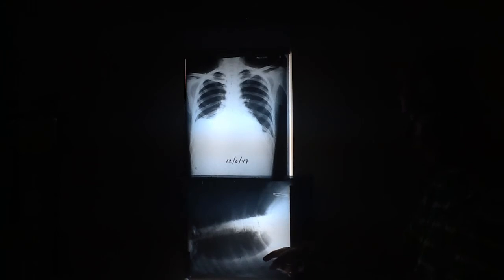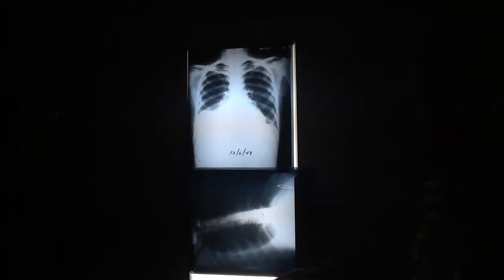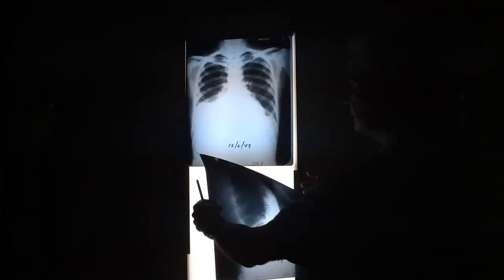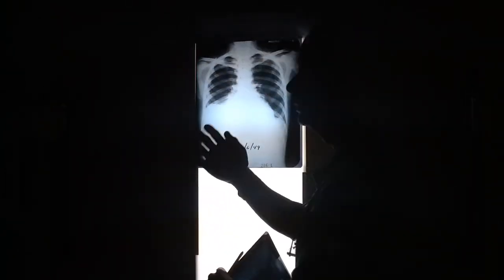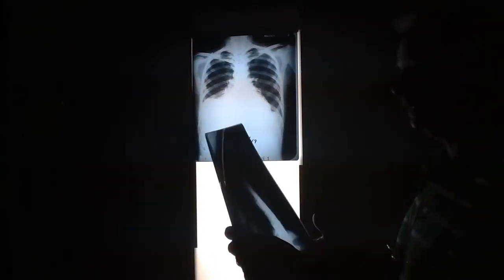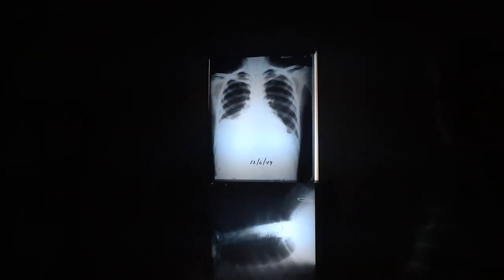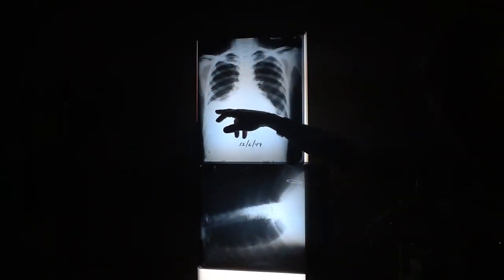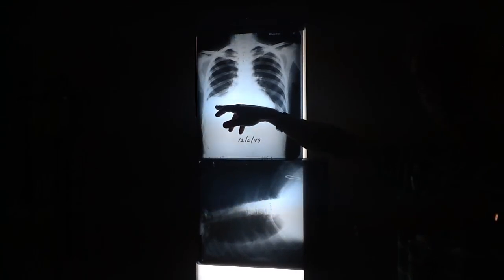And when you lay them down, look what it did. Then it layers out along the chest wall. And if we stand them up again, it goes back down like this, over the diaphragm, and lifts the lung base up off the diaphragm. Why it does that, I have no idea. But it only does it in a very small percentage of people. It's an atypical pleural effusion. It's called subpulmonic, under the lung, or infrapulmonic pleural effusion.